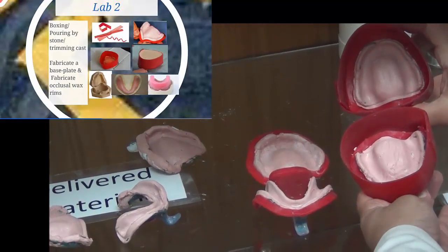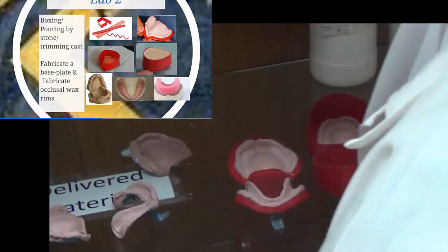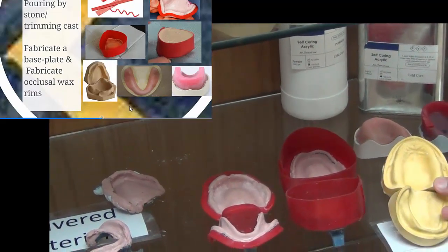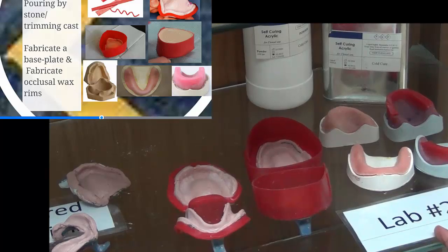And inside that box, we pour our stone, and the result that we get are secondary casts. What do we mean by secondary casts? Secondary casts are casts that are stronger. They're made out of stone, not plaster. So these are the results of lab number 2.